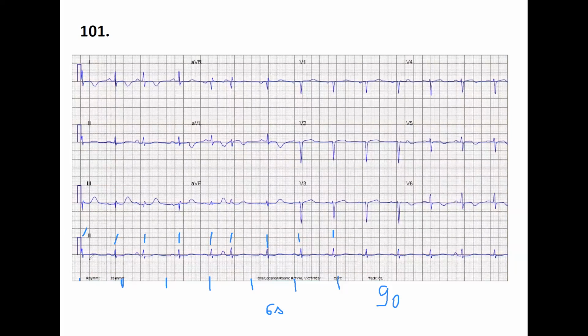Why is it arrhythmic? Can you point to the beats that are out of order? The third QRS, then the fifth, sixth as well. Exactly. So the others are rhythmic except these two. Now, one thing that you can see immediately: this distance is shorter than this one.